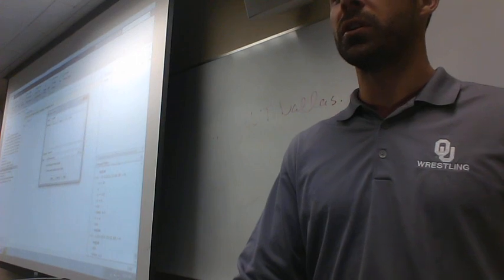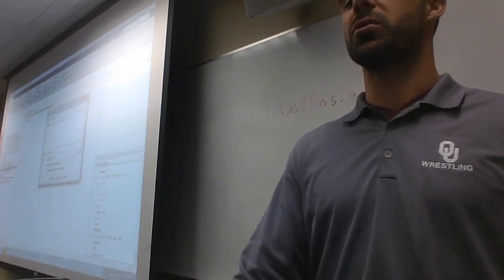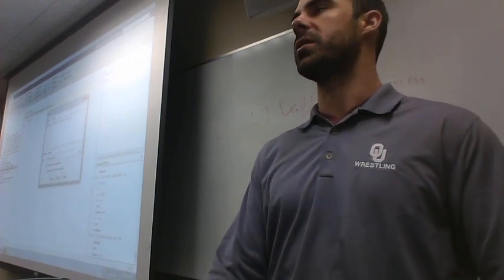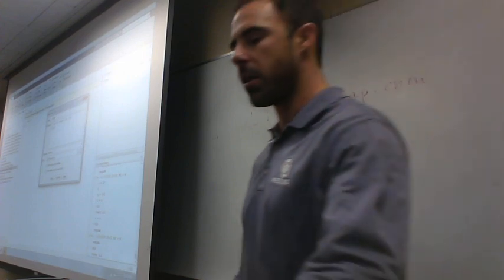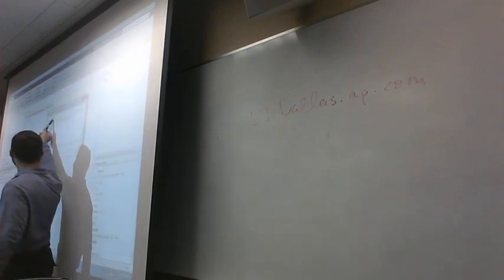And what you do is it asks you to type in a code of what the actual callback information is. So in this case, all that it's representing is just the command of EEG Lab. So we type that in again. Now, some of the background information here is that we could call this any name we want.